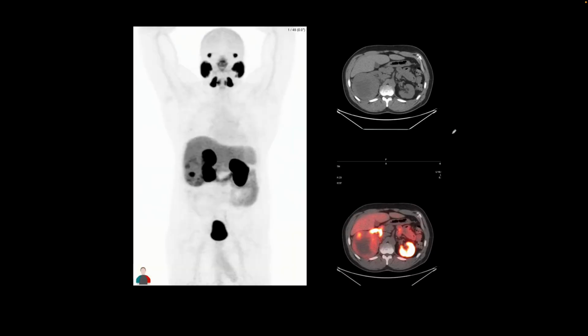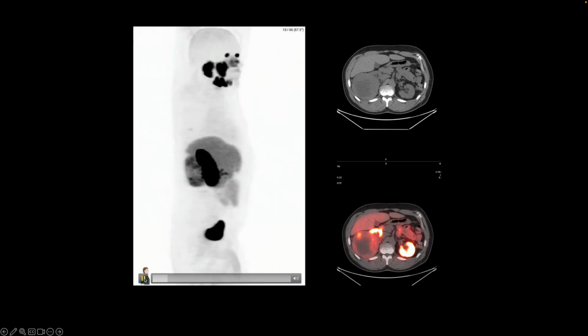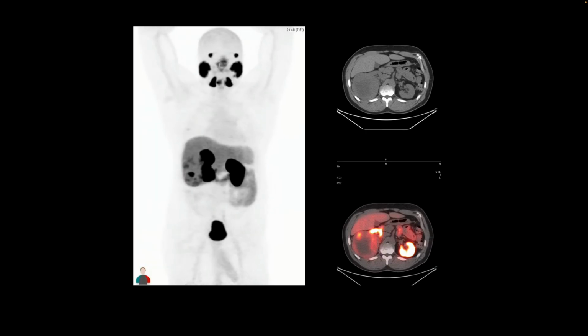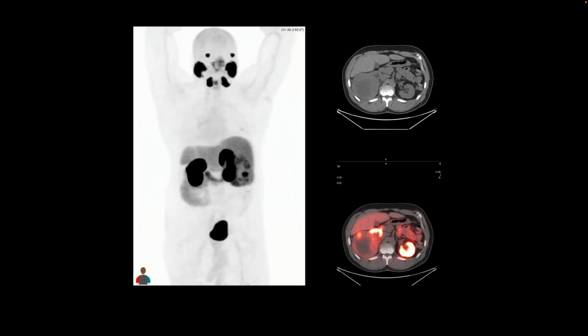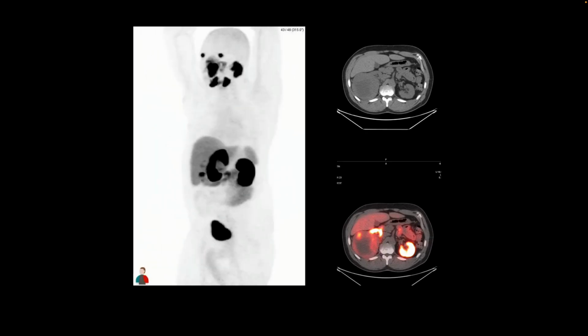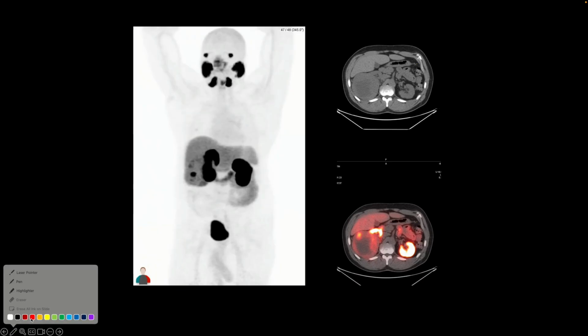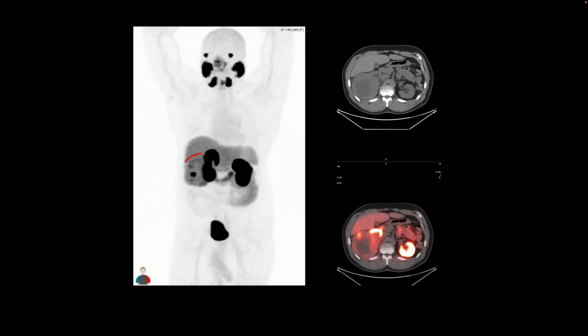This is our next patient. They underwent a PSMA PET-CT to look for recurrent prostate cancer. Here's the rotating image. We do not see any focal uptake to suggest recurrent prostate cancer, which is PSMA avid, but we do see a large mass arising from the right kidney. This mass is exophytic and shows heterogeneous, mild to moderately severe or intense PSMA uptake.